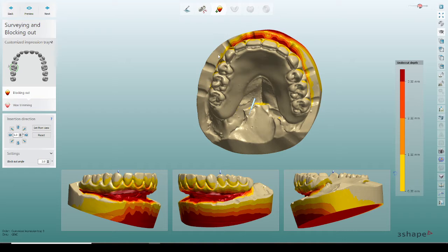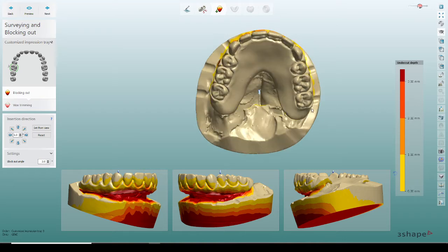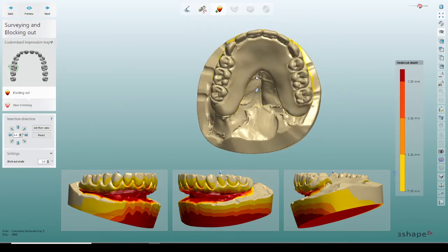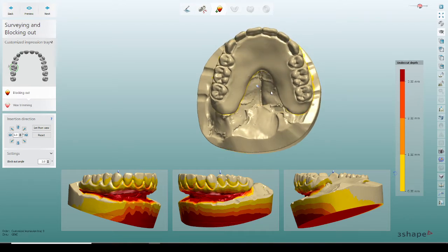I'll put a couple of grooves all over the model. That's very important because you want something to be able to interdigitate the cage when you design it on top of the model. I'll skin that in and bring it into my 3Shape into the custom tray module.